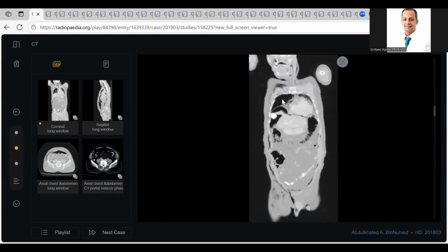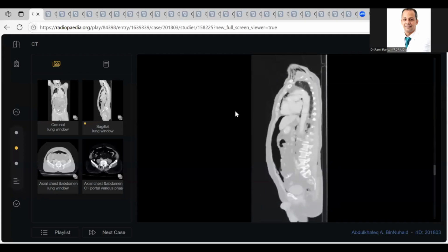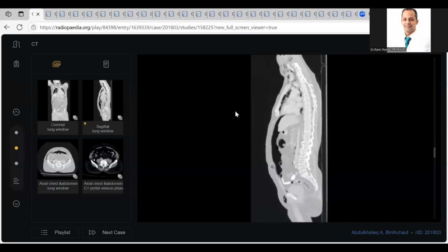There is a right-sided pneumothorax, plus surgical emphysema extended up to the neck. Plus, see this pneumorachis? In the spine, in the spinal canal. This is a typical viva exam case, and also a typical long reporting case.